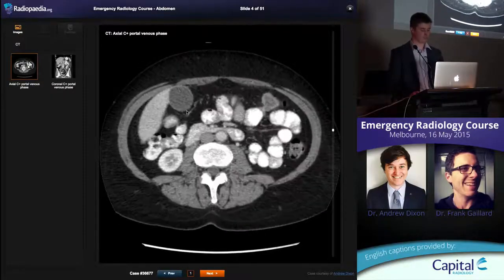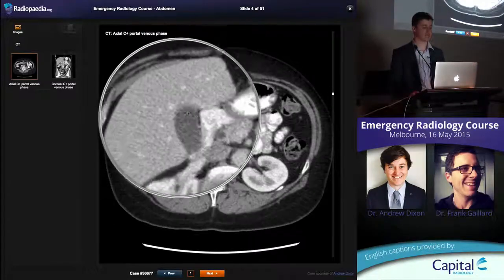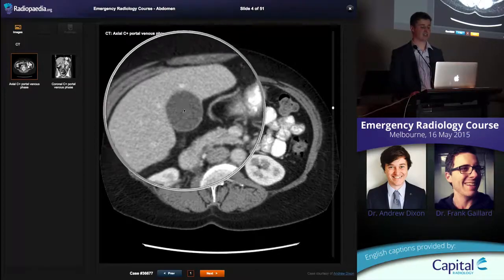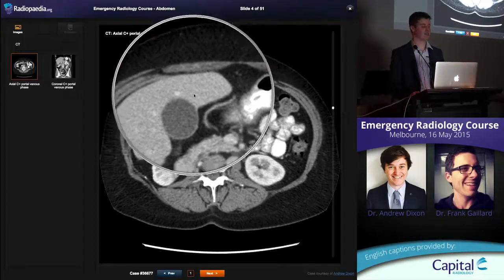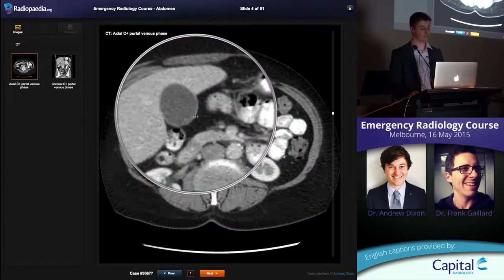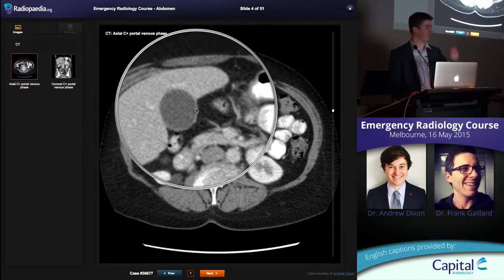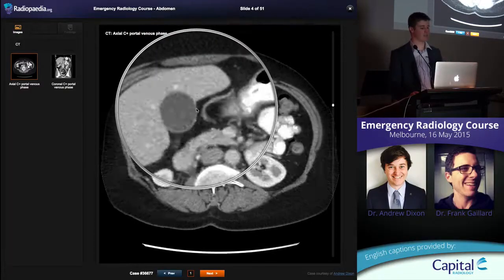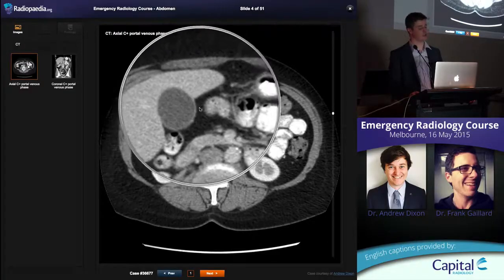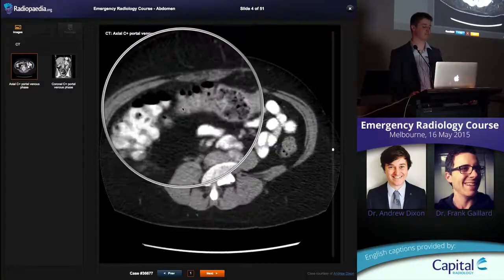Okay, gallbladder here, sitting underneath the liver. I just want to point out a nice fluid density. Okay, fat density black, fluid density grey, enhancing parenchyma inside the liver, nice and bright. I want to point out, see just the slight brightness to the wall of the gallbladder? That's the enhancing mucosa, okay? It's really, really thin in a normal gallbladder, really thin enhancing wall, nice black pericholecystic fat, okay?